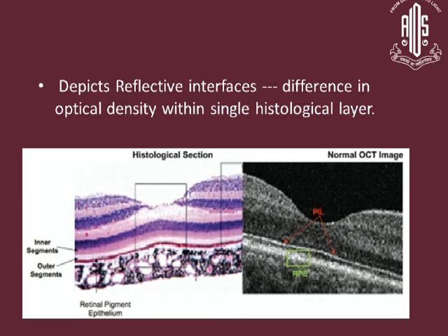In virtually all good normal eyes, there is a very good photoreceptor integrity layer, and most of the studies have said that when there is a loss in this layer, it can be taken as the photoreceptor layer, and that person is not working sufficiently.